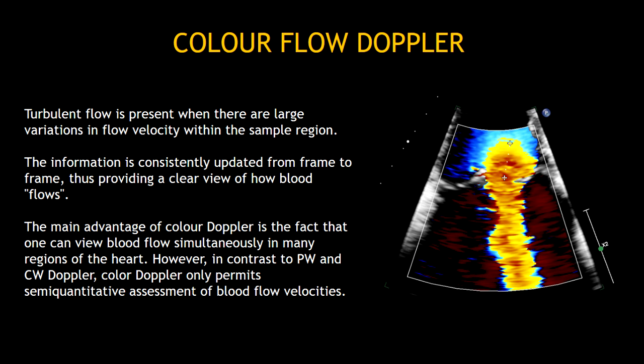The main advantage of color Doppler is the fact that one can view blood flow simultaneously in many regions of the heart. However, in contrast to pulse wave Doppler and continuous wave Doppler, the color Doppler only permits semi-quantitative assessment of blood flow velocities.